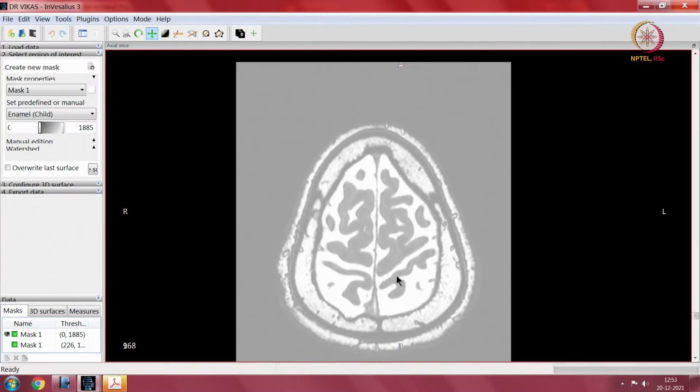So, we will break here and then continue along with this. We have identified the midline and how to identify structures on the surface of the brain just using brain imaging, to find out on the 2D what I had taught you in 3D.